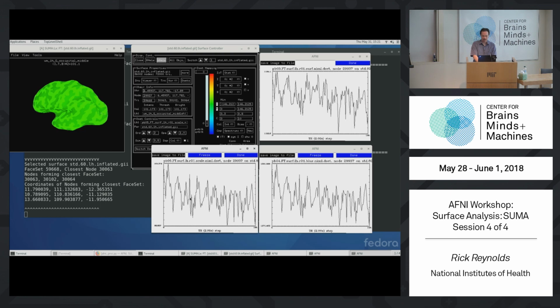So now we can compare. On the left, we have the scaled time series. On the right, we have just the blur data set. How do they look? They look the same, right? It's just a scaling of them. And in the NIML dset format, these are no longer scaled short integers. I think these are actually stored as floats.